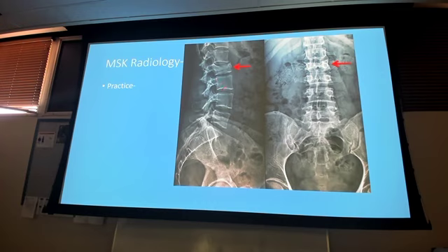Look at the radiolucency of the vertebrae. Look how dark they are compared to maybe the sacrum or some of the healthy lumbar spine we've looked at. It's almost the same density as the soft tissue area, and I can just make out the cortex of the vertebrae. So this is definitely a patient with osteoporosis as one of those signs. And we'll look at that again when we get to the lumbar spine section to talk about the difference between the two. Yes, sir, what's your question?